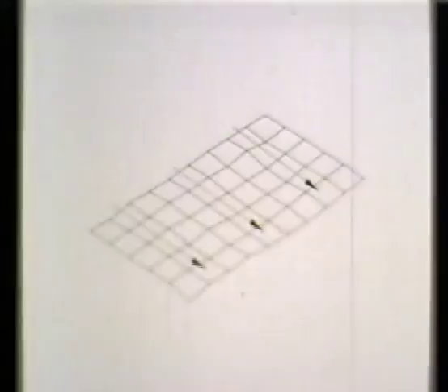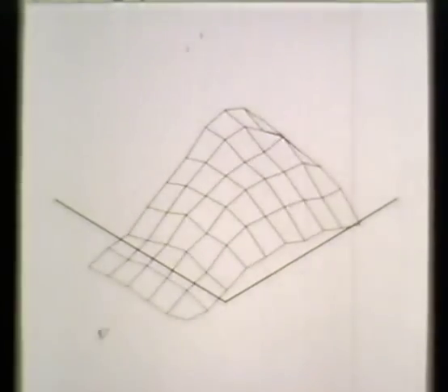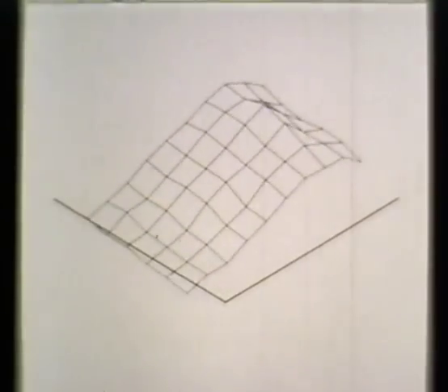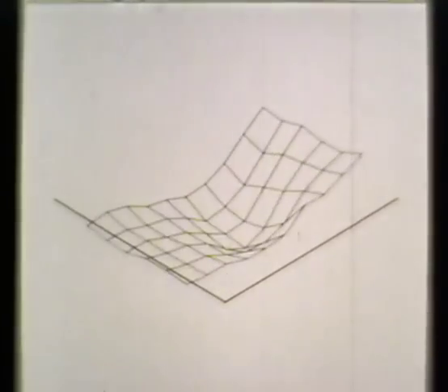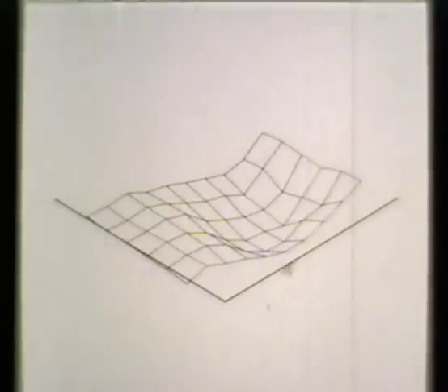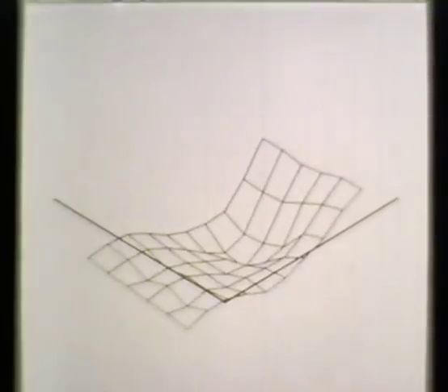The larger electrode array is 4 by 7 millimeters and covers most of the lateral surface of the bulb. There is a lesser degree of coherence of activity on the surface. It is likely that there are 2 or more active foci in the bulb and that the surface activity is a reflection of multiple coherent domains.